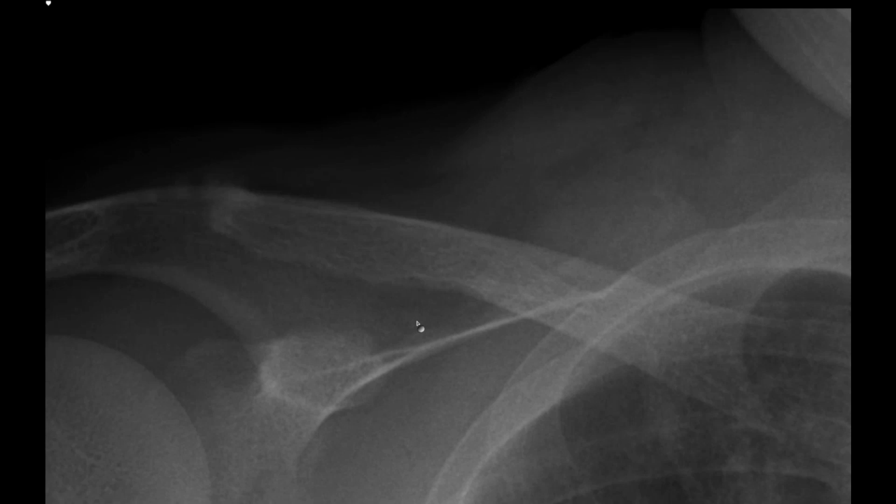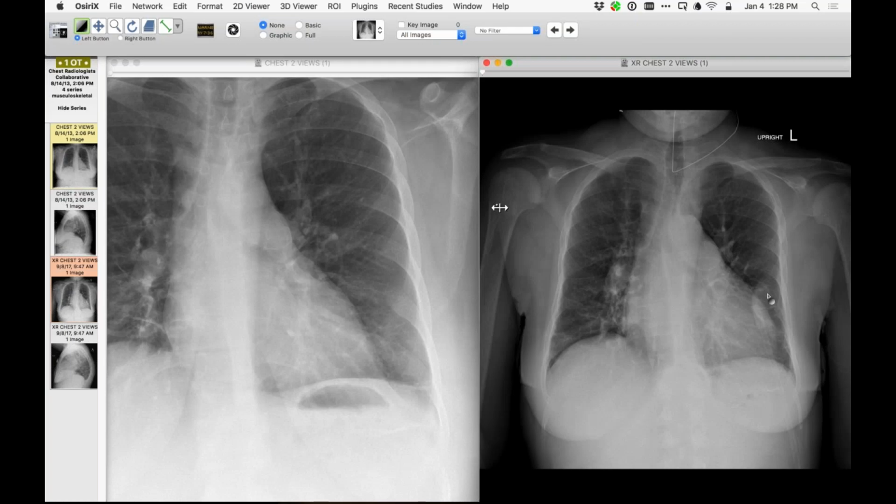Exactly. Good. Yeah, I'm not sure I picked that up or I went right by that, so I'm going to look some more and see if I can figure that out, and look at the lateral more carefully to see whether we can identify potential brown tumor of rib. Great. Yep. Yeah, that'd be great.